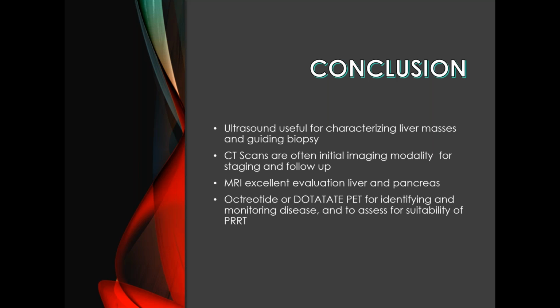The typical CT chest has thinner cuts, down to 0.6 millimeters, which is really thin, so you will have better resolution. Whereas with DOTA-TATE alone, you might not have that resolution, and you will have breathing motion artifact with our localizer CT. So just keep that in mind.